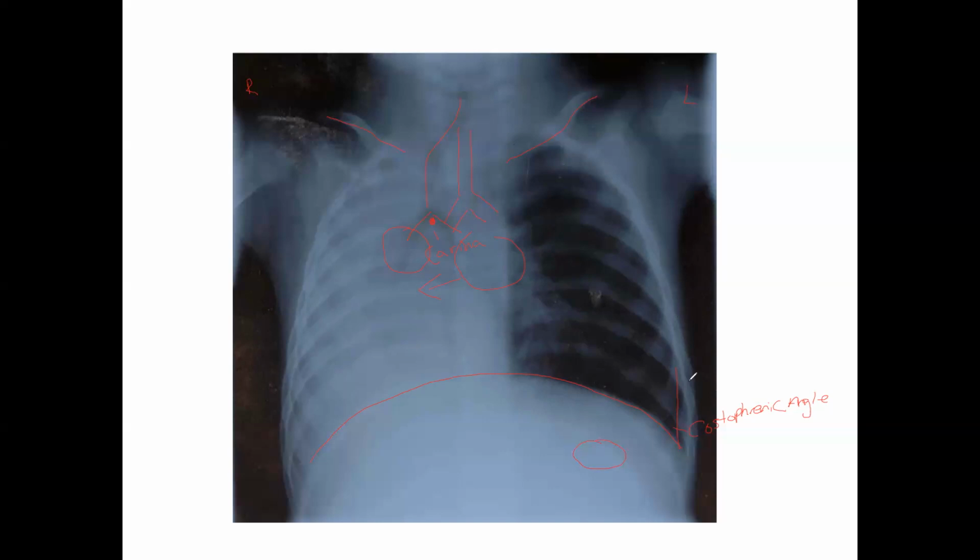So you've got an anterior posterior film that is done more so on the portable side of things, because not every patient in the hospital can be delivered to the radiology department for a chest x-ray. So some of these things have to be done portable. With the AP portable film, because the organs lie a little bit closer to the x-ray source, your heart and stuff may be magnified a little bit.